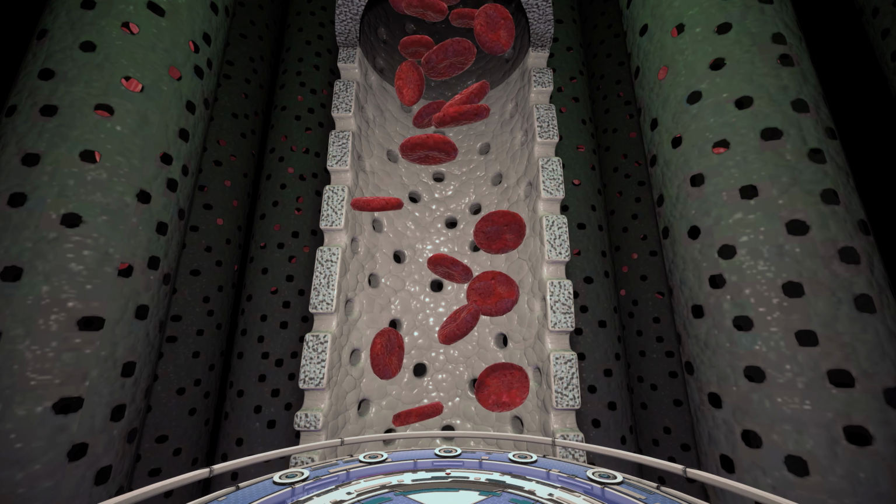What are we removing from the blood? During dialysis, we aim to remove excess water and solutes: urea, creatinine, beta-2 microglobulin and electrolytes, such as potassium, sodium, magnesium, and phosphorus. Albumin, which is a protein that the patient's body needs, is too large to fit through the dialyzer pores. The pore size was determined on purpose, so dialysis will not remove albumin or red blood cells.